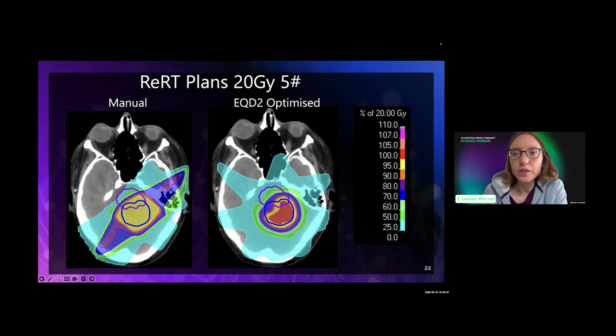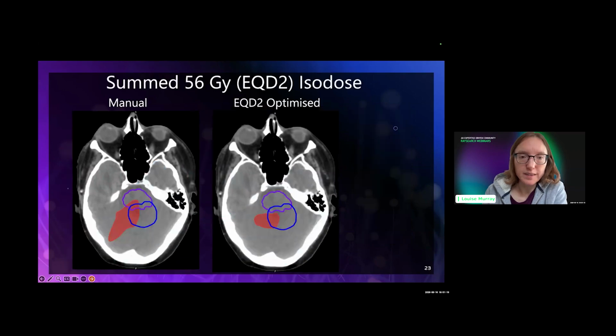Now, nobody knows what these cumulative tolerances should be. Nobody knows how much recovery is correct, but these are kind of reasonable parameters that have been used, and you can reference them, therefore perhaps justify, but nobody knows. So with our tool, we could have given a higher dose and a more informed dose distribution thinking about our organ at risk, our brainstem in this case. As I said, we gave 20 and 5 because we assumed that absolutely had to be safe. If we say, well, let's say the cumulative tolerance is 56 Gray, 25% recovery, what did we actually do?